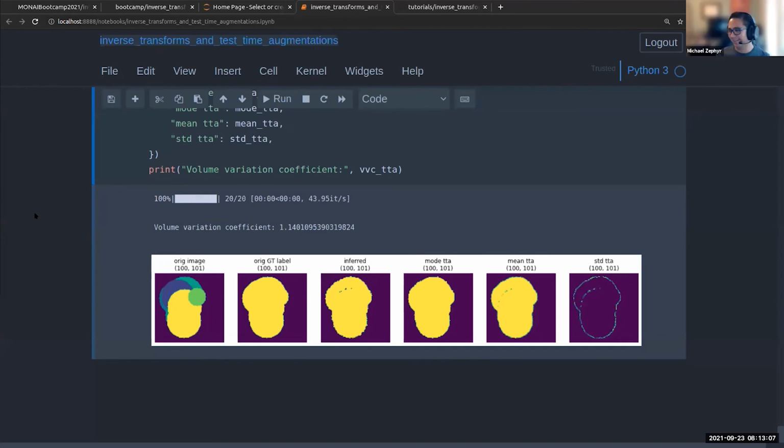Yeah. The argument to the random rotation, I think, is range X, range Y, and range Z. And so if you want, you can give a single value. And I think then you'll go from negative. So if you did pi, for example, you go from negative pi to plus pi in the X direction. So that's a rotation around the X axis. And I think if you give two values, which is what I did, you'll say, I want you to go from 1 radian to 2 radian.